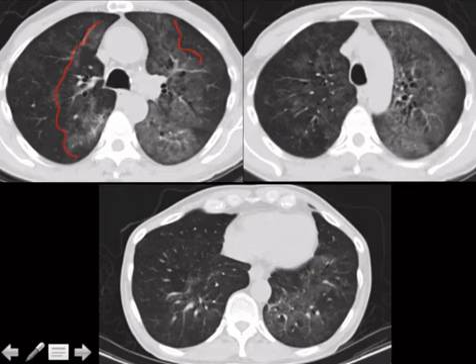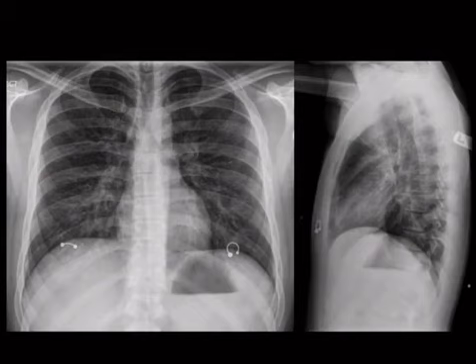So this is really vague, right? This could be lots of stuff. This could be pulmonary edema. Maybe it could be ARDS. It could be lots and lots and lots of different stuff. Without any history, it's very difficult. Infectious processes can look like this. But for multiple choice, they're going to have to give you a hint. So here's your classic hint.